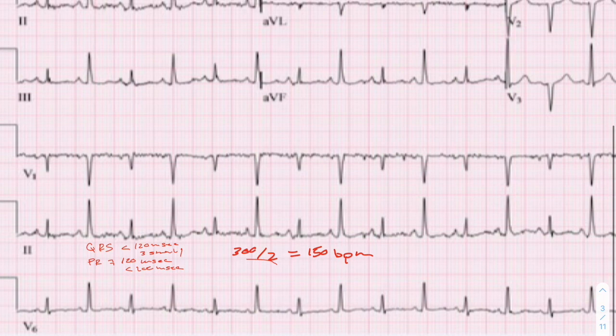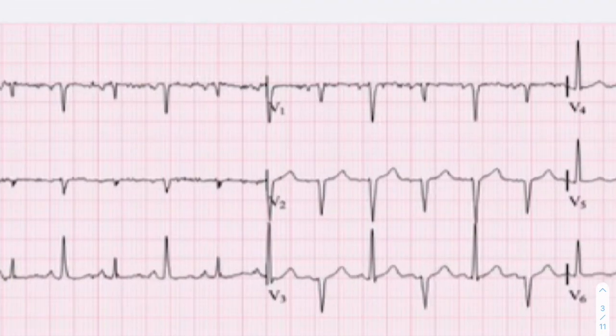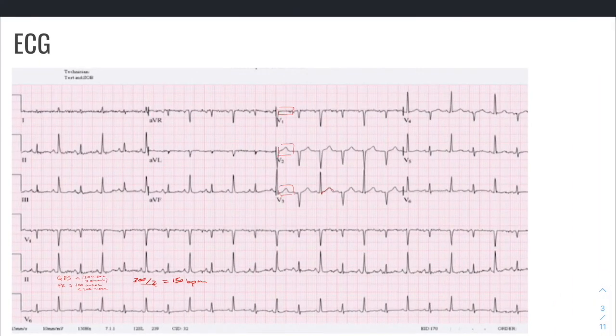And last but not least, looking more globally at the ECG, I'm using the rhythm strip right now, to see if there are any changes in our ST segment. It looks a little stranger than you'd expect, but there is, for instance, an ST segment in V1, V2 that has a nicer picture, and same with V3, and you really are seeing this return to the isoelectric line after the S wave before the T wave comes in, and that's really what we're looking for with our ST segment.